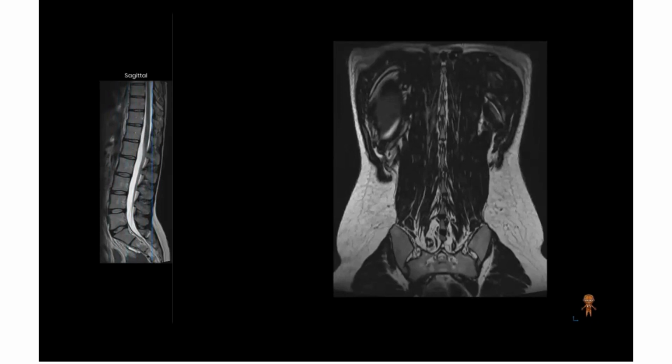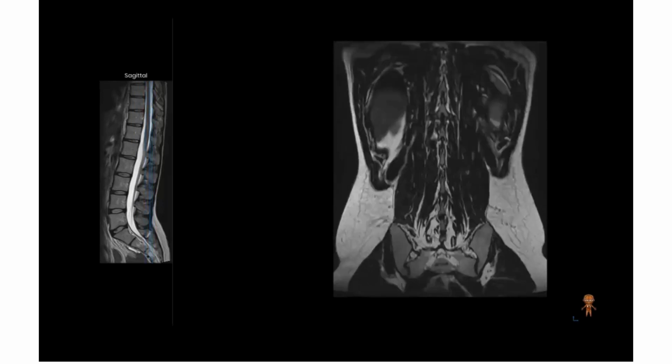So which one is important for us? Like the sacroiliac joint, SI joint. Okay, the sacroiliac joint is like this, right? On both sides, they are vertically oblique inwards. They are like this on both sides. If you want to study the entire SI joint, you have to take sections from anterior to posterior or posterior to anterior.